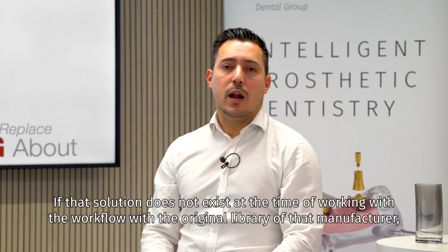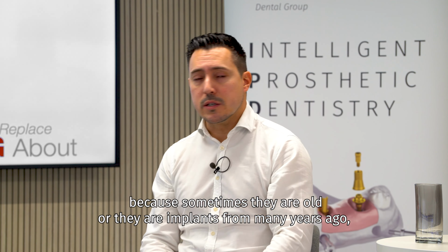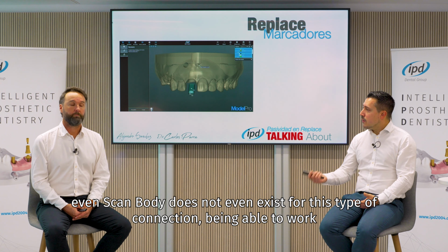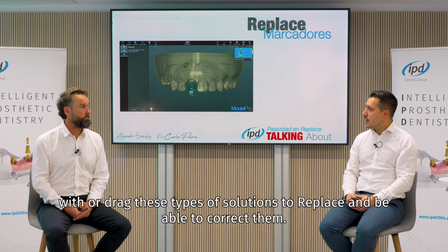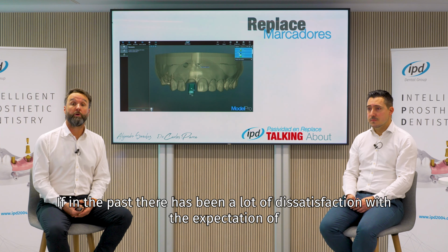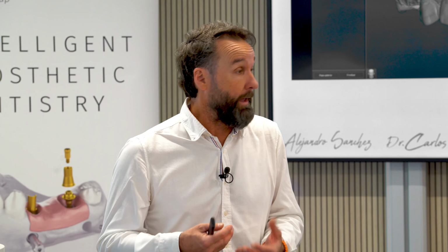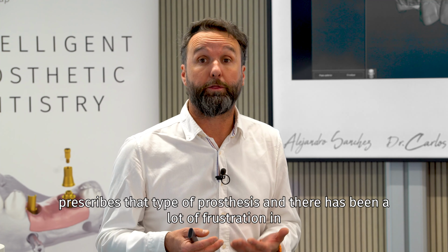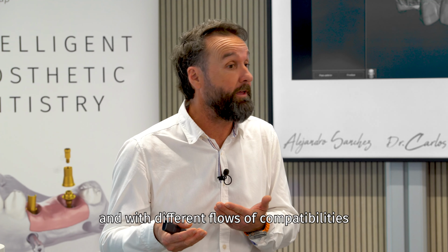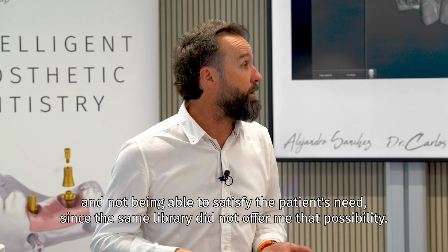If that solution does not exist at the time of working with the workflow, with the original library of that manufacturer, because sometimes they are old or they are implants from many years ago, even scan bodies do not exist for this type of connection. Being able to work with or drag these types of solutions to Replace and be able to correct them seems fundamental to me. In the past there has been a lot of dissatisfaction with the expectation of the prosthesis that the patient demands in the clinic, the clinician prescribes that type of prosthesis, and there has been a lot of frustration in the laboratory when we have encountered different brands with different fields and with different flows of compatibilities, and not being able to satisfy the patient's need since the same library did not offer me that possibility.